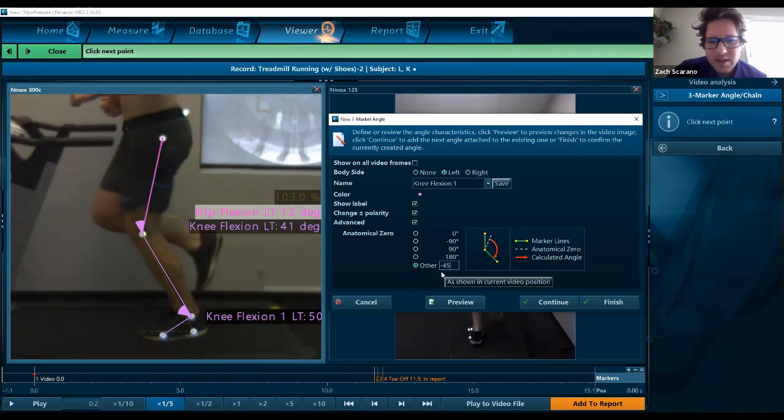One reason that this is difficult is because you often have to track the measurement first to define where that 0 actually is located. So keep that in mind if you ever try and give that a go. So we'll go ahead and click cancel on this one because we don't want to continue it.